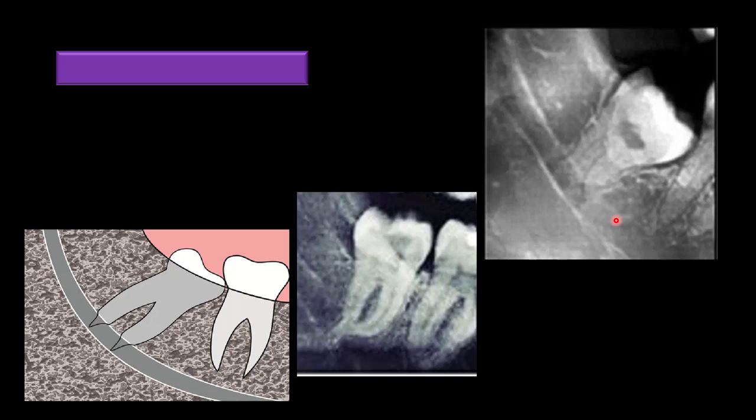Narrowing of the root: the part of the root that the canal is superimposed on is seen thinner. Bifid root apex: you see a double apex. In one line you see the root and in the other line you see the lamina dura.